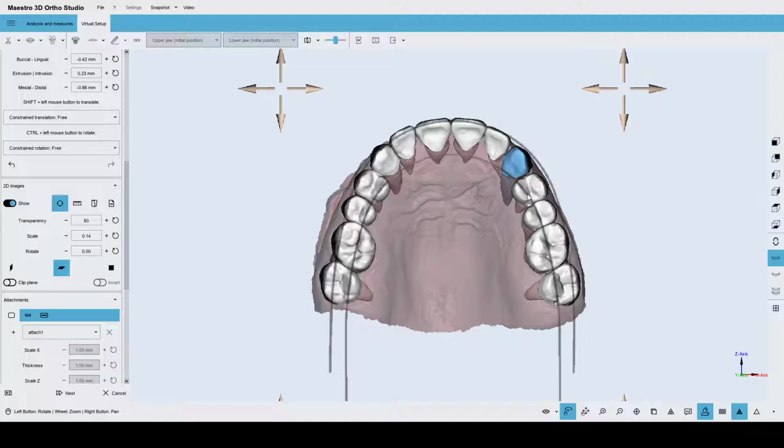into an expected position, assigning a shape to my model, to assign a given shape to the alignment.